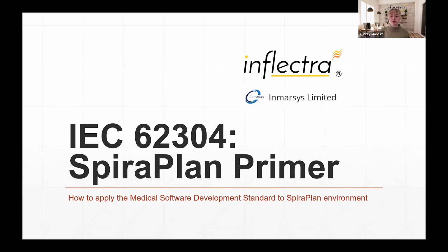This is part 2 of a short webinar series that we're doing with Vlad. In today's webinar, we're going to be using the concepts learned in the last webinar and exploring how this essential medical software development standard is applied in SpiraPlan. And this will also include a live demo in SpiraPlan as well.